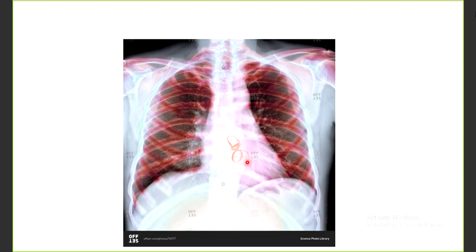So we know that this cage is a mitral valve cage. Same way, the ball moves forward and helps the flow of blood from the left ventricle that is below to the aorta that is above. So we know that this valve is an aortic valve, ball in cage, prosthetic, mechanical.